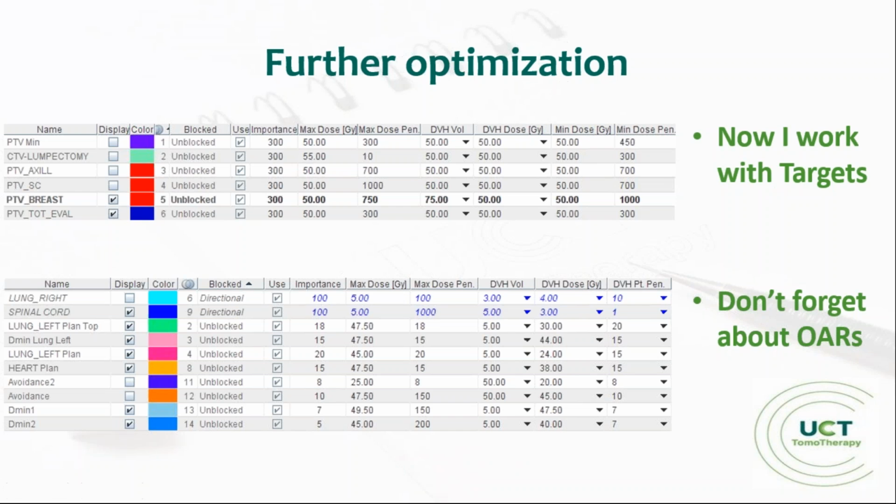After this, I wait for maybe 30 iterations, and I see what happens. And then when I have some problems or something that I want to change, I just increase the penalties. So here is the middle of optimization.